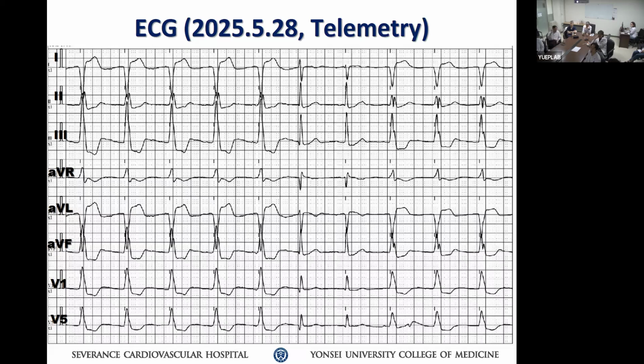And then the pacemaker rate looks more regular now. So maybe you can argue, what? Retrograde P wave or independent pacemaker atrial activity? Because it looks like whatever the activity here is positive in lead 3, we can see. So it cannot be coming from below, maybe above.